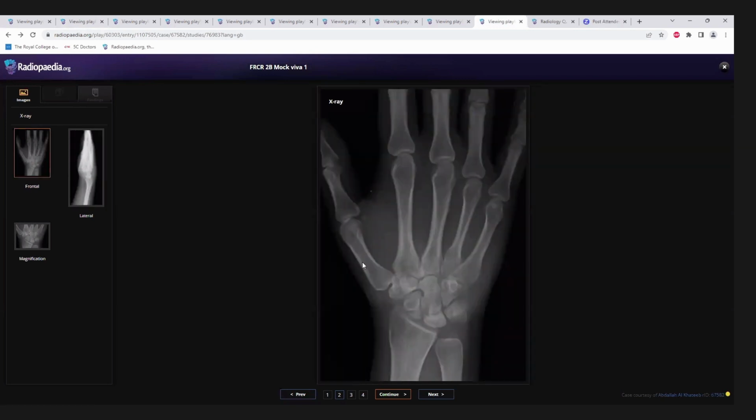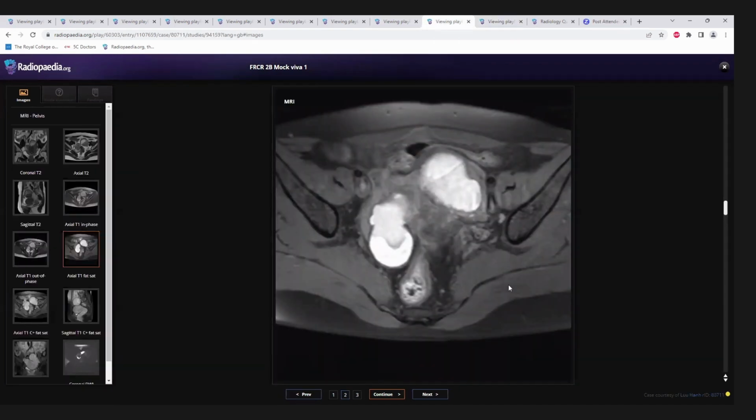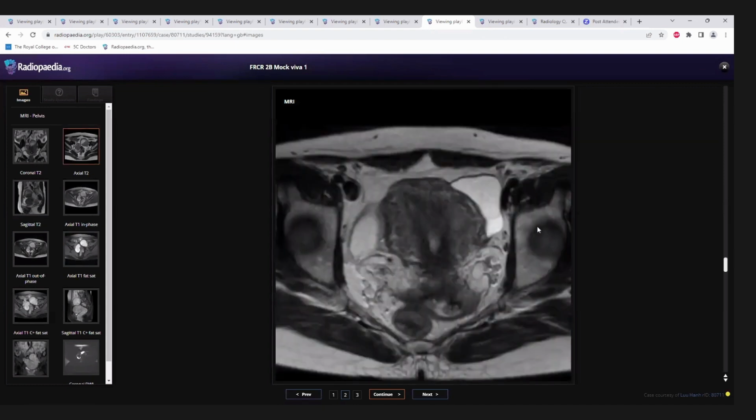Okay, we will put it in the chat box. They will not expect it, but they may expect the name. So Kienbock's, negative ulnar variance, 2.5 mm, and the classification. There are 4 grades. All right, this case, I just want to really drill it into everyone's mind.